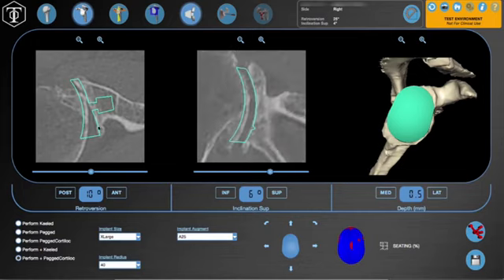So at this point, one of the things I will notice is that there is some overhang of the implant anteriorly and posteriorly, and if I want to, particularly for a difficult exposure like a posterior retroverted glenoid, you can downsize the implant one size, and that'll still get you nice coverage over the native glenoid itself, and that will help with exposure purposes. We have 97% seating, and we're really not violating much of the subchondral plate. You can see as you medialize it, it'll obviously come to 100%, but as you medialize the implant more, it will take more subchondral bone. So even with 1 millimeter from full depth, we still have 80% seating without violation of the subchondral plate.